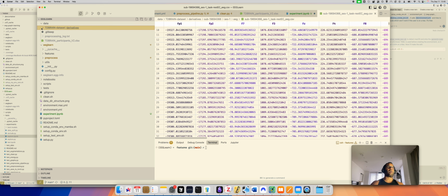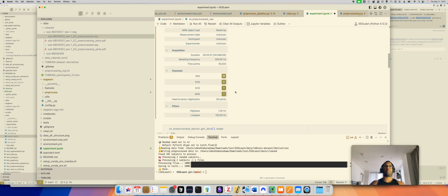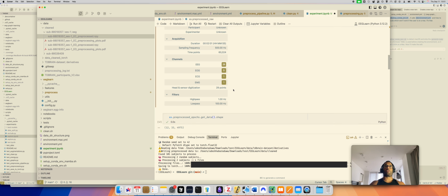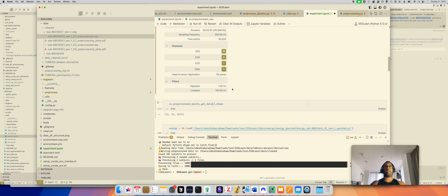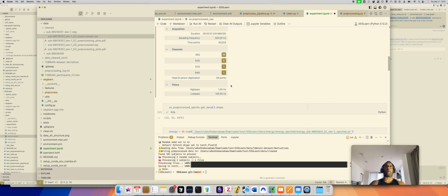So all of the things you're familiar with in MNE are, in theory and in practice, at least in my experience, available for you to use on this, both on the epochs as well as the raw object. Okay, so these are all fine. Yeah, so you can do all the MNE stuff you want, and that's basically it for the pre-processing. Everything's handled very automatically on the back end.